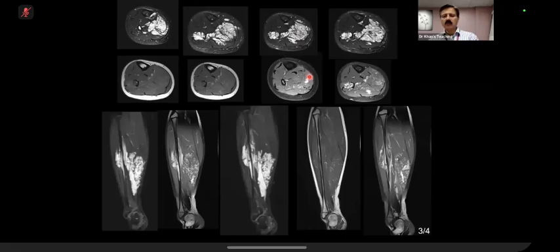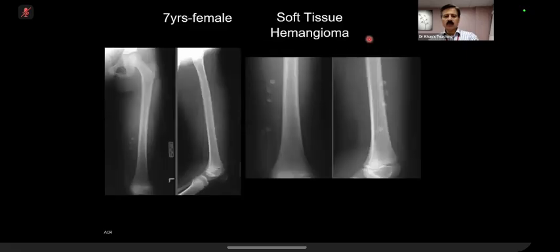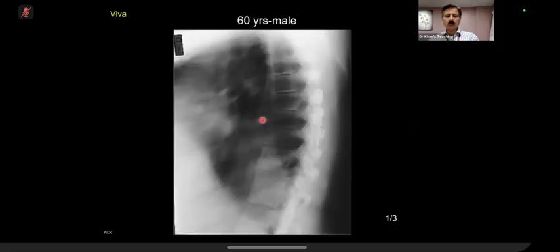And intramuscular hemangiomas, classically, another viva question is, how can you confirm it? What they do in RNOH is a Doppler. This is a very compressible lesion, and that is also considered diagnostic. So, just to make the same point, with intramuscular hemangiomas, you have to look for phleboliths.